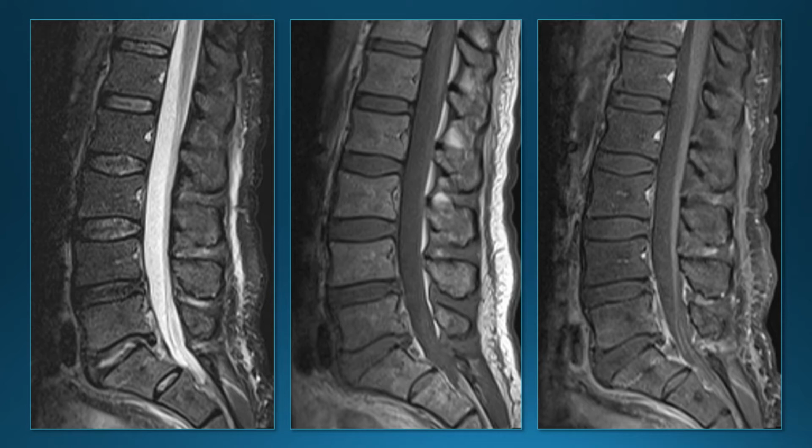Okay, so let's go back to our patient who came in and had the neck surgery. Let's look back at his original lumbar MRI and see if there were some signs of infection that we missed. So this was the midline sagittal image. If we look carefully, maybe there was some soft tissue thickening here. The end plates are pretty sharp, so that's okay. There is some T2 bright signal in the disc that we noticed, but again, we can see that with degenerative changes.